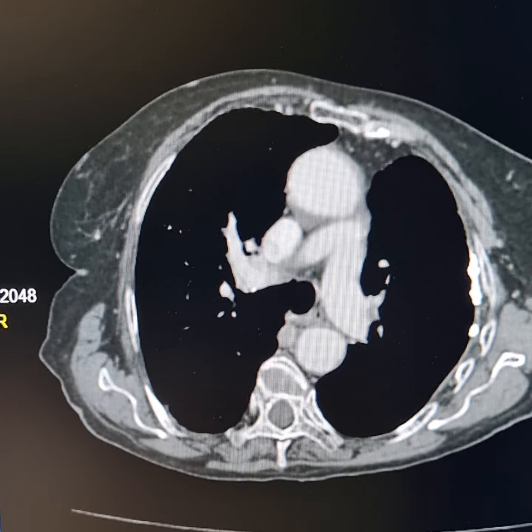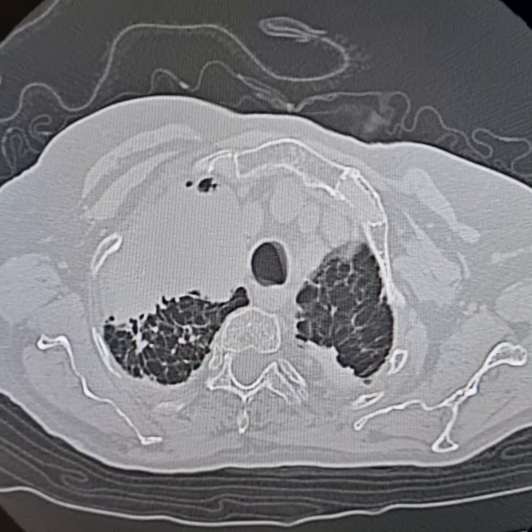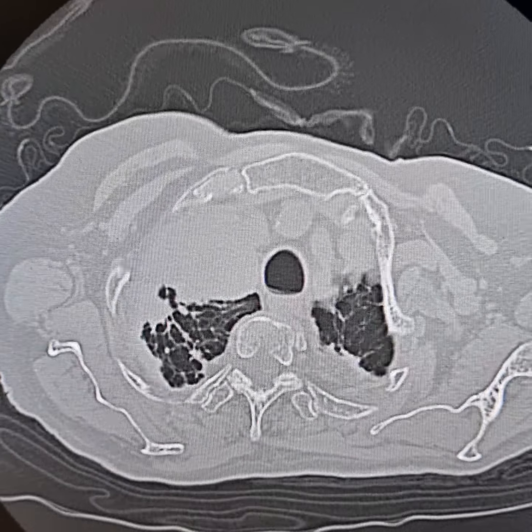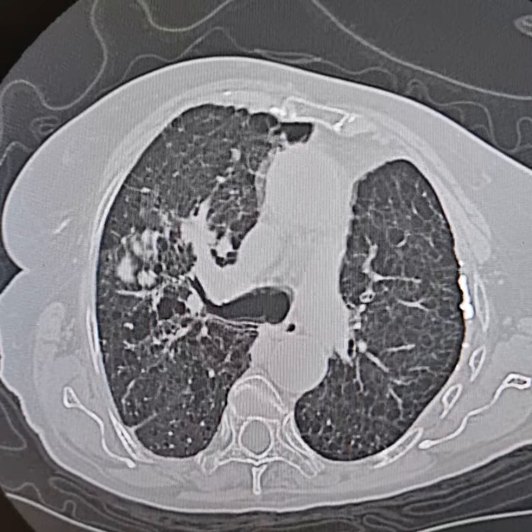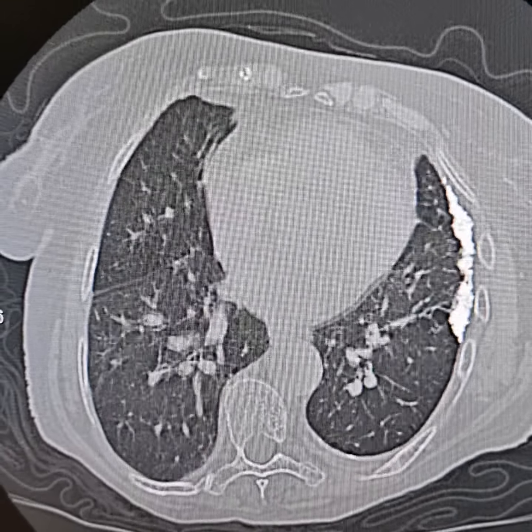Now I will show you the lung window details. This is the HRCT reconstruction. Now please observe these emphysematous bullae. Centrilobular emphysema is present in both the lungs. Involvement of the upper lobes is relatively more severe as compared to the lower lobes.